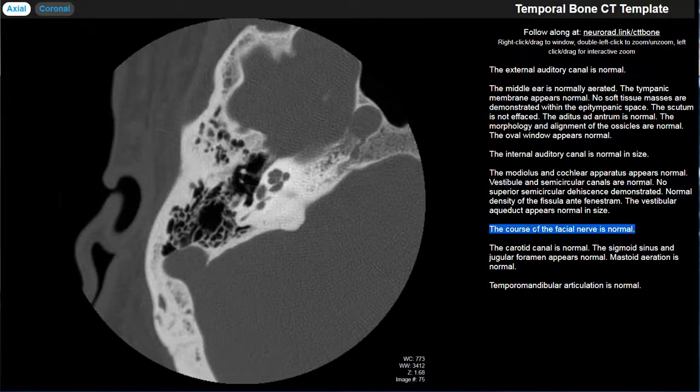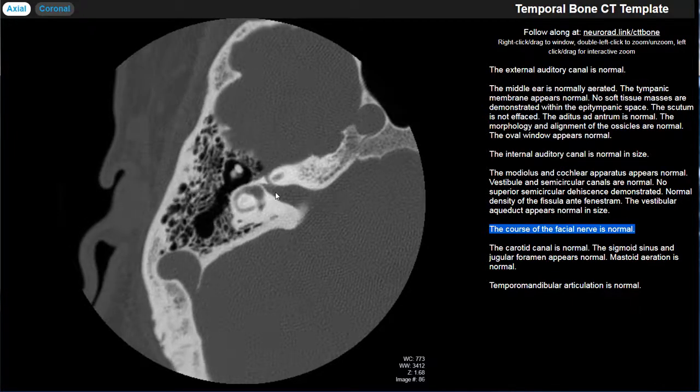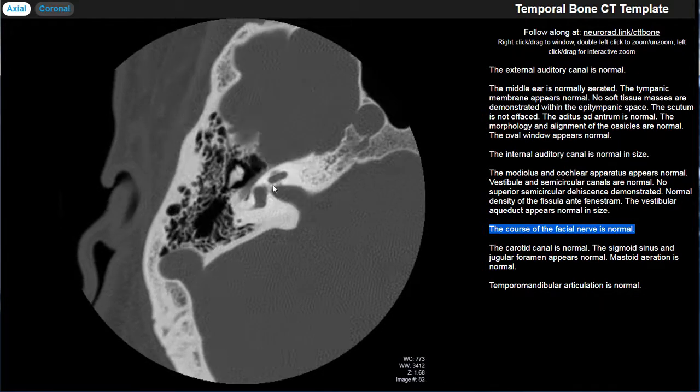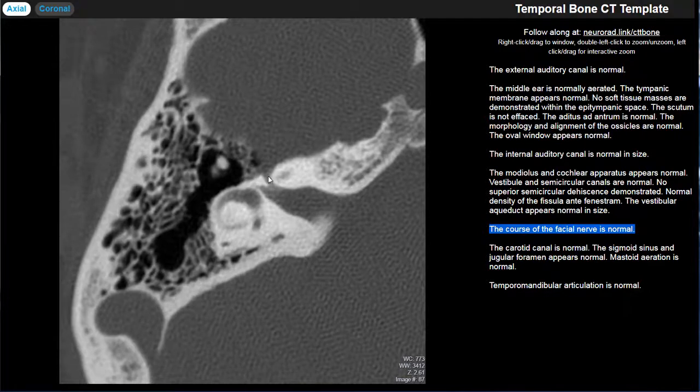All right. Moving on from the inner ear structures, I'm going to talk about the facial nerve and the course of the facial nerve. So there's a lot of twists and turns to it that are useful to become familiar with. It's going to come out of the brainstem, pons, pontomedullary junction region. It's going to be the cisternal segment in the cerebellopontine angle cistern. Once it enters the internal auditory canal, it is the canalicular segment. Then it's going to pierce the otic capsule and course above the cochlea. And that short segment there is called the labyrinthine segment.